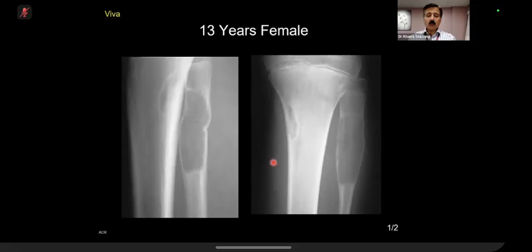So your thinking was absolutely spot on. But the but is that in the narrow bones, basically fibula and ulna, these rules of eccentric or central, which I showed you on that diagram, do not hold true, because there is not enough place for the lesion. So your thinking was spot on. But this is a non-ossifying fibroma.